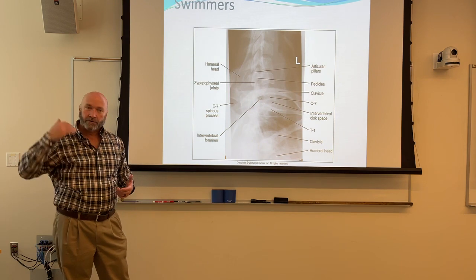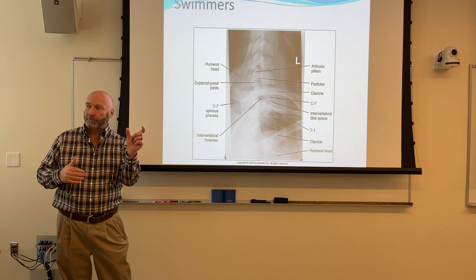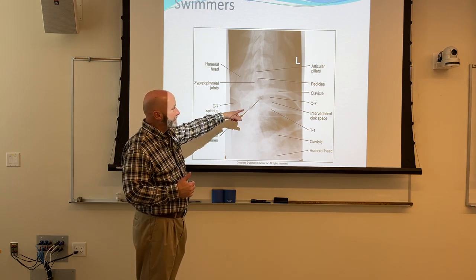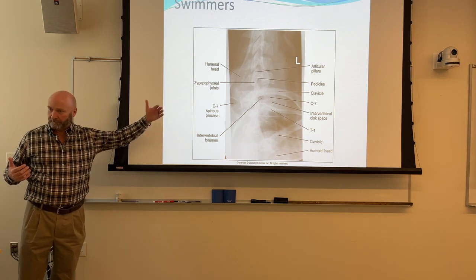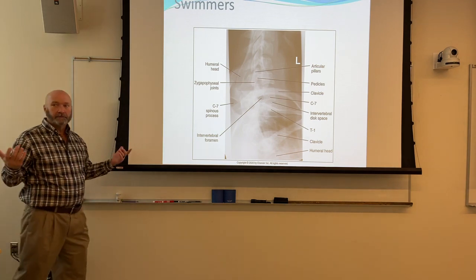Right? So down at the bottom of the C-spine, your spinous processes get much, much larger. That's a good indication of C7, and better than that, right? What if you've got a patient who's got one of those long necks and low shoulders? Is that going to be accurate? Is it always going to be going across C7? The answer is, I don't know.